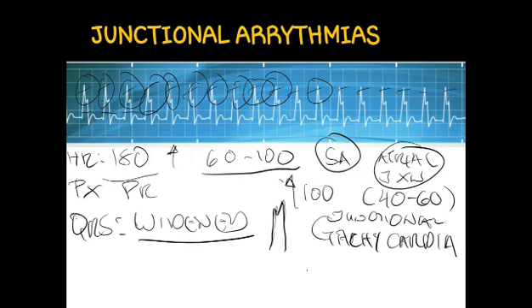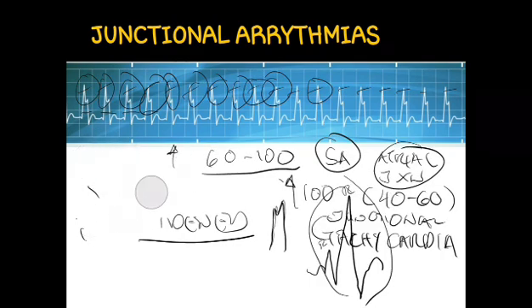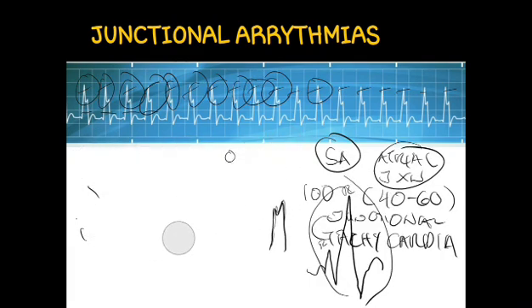But if you're going to see a rhythm that looks like this, this one, guys, is the hallmark of your right bundle branch block, wherein there are two R waves. Just in case, this is just a side topic, so this will be discussed in a separate ECG course.